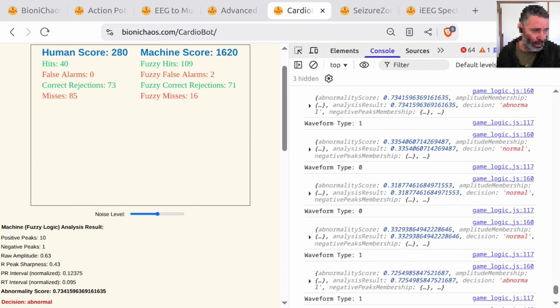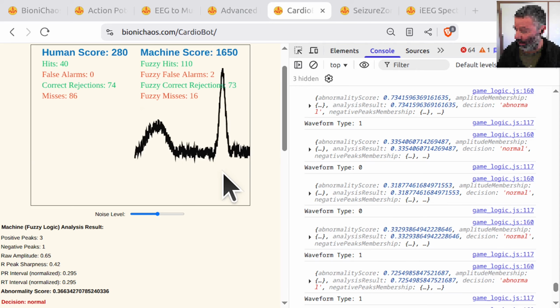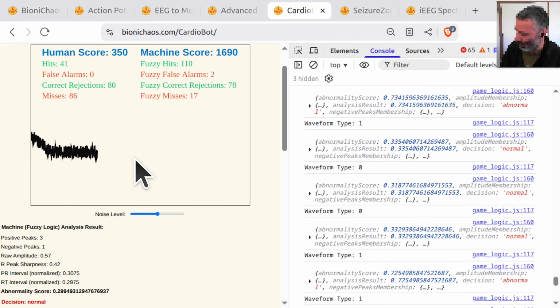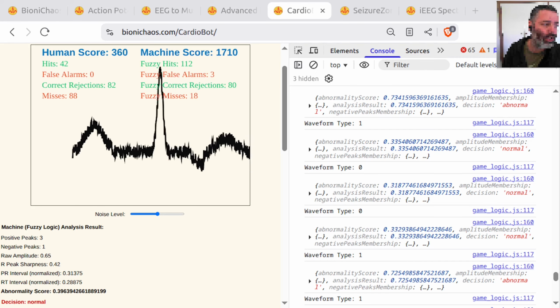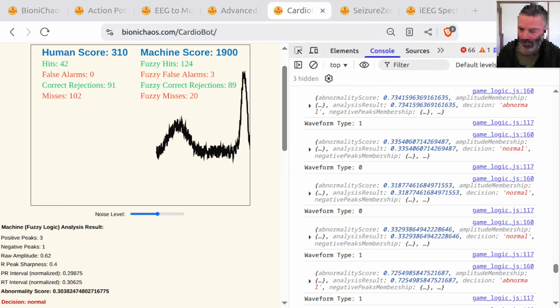Yeah, so we're trying to figure out if we should replicate it in JavaScript alone, and also potentially prevent it from giving too many normal ECGs. Could improve the waveforms as well, as in make it more comprehensive, add more different types of waveforms. So for a web application like this, do we need a Python backend, or looking at the code above, can we replicate everything in vanilla JavaScript?